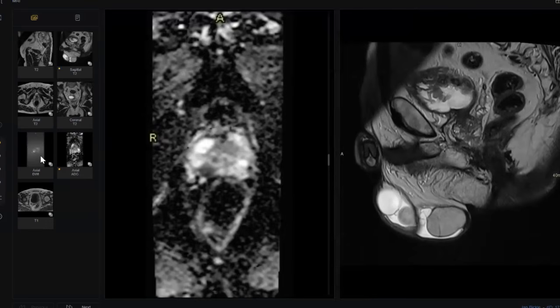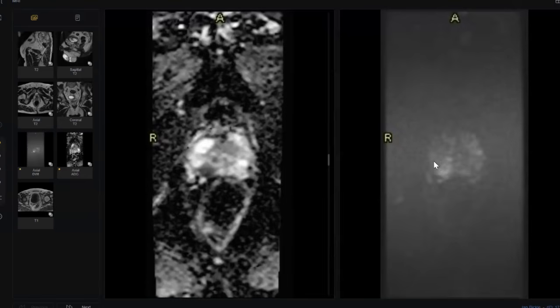This is the DWI. Okay. Oh, okay. The suspected area has highly restricted diffusion here. So it is surely malignancy. At least give it PI-RADS 5 and you are 100% sure. Is it clear for all of you, my colleagues? Yes, sir, it is clear. For the central zone, this is as a general rule to facilitate, to make it very easy.